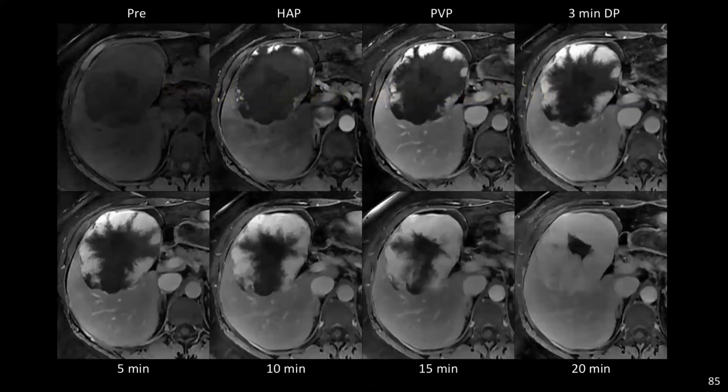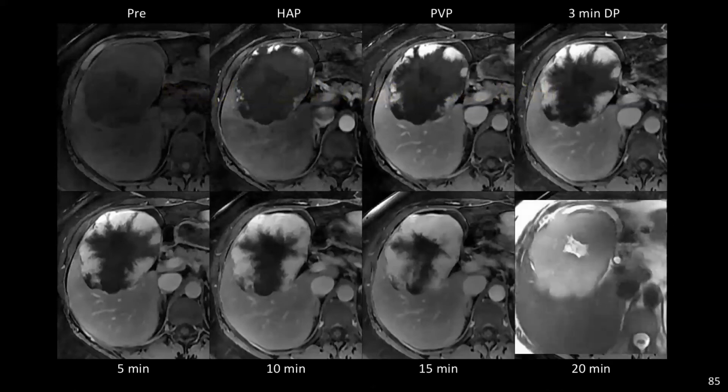Now, this large area of central liquefaction is sometimes called a central scar, but notice that this central scar looks nothing like the central scar of an FNH, which was delicate and stellate. This looks like a large cavity. And if we look at a T2 weighted image, this particular cavity is very liquidy bright. So it's not just a little bright, it's liquidy bright, because it's not a scar at all. It's literally an area of cystic degeneration in the middle of this particular lesion.